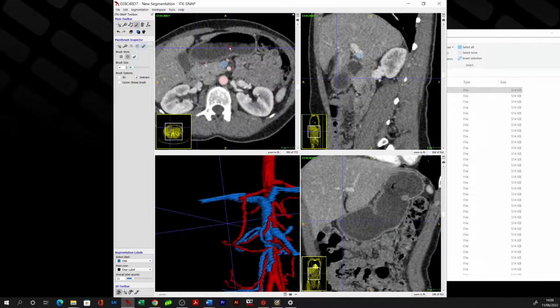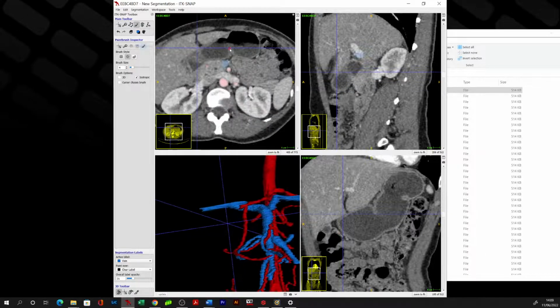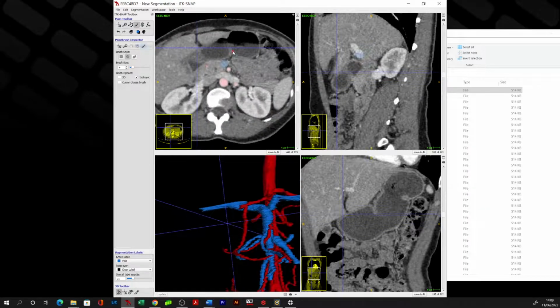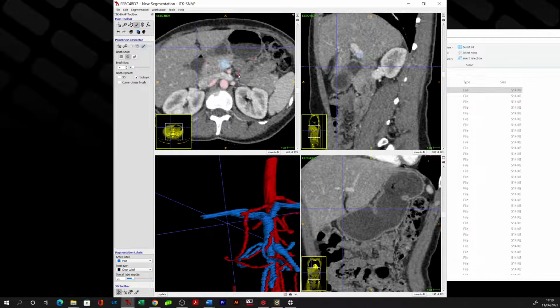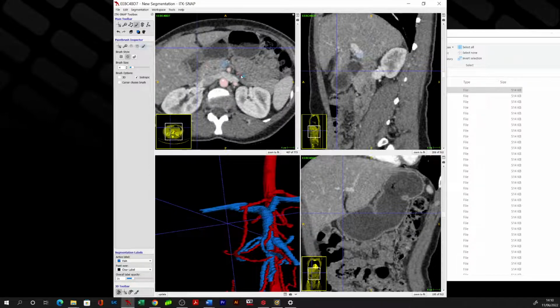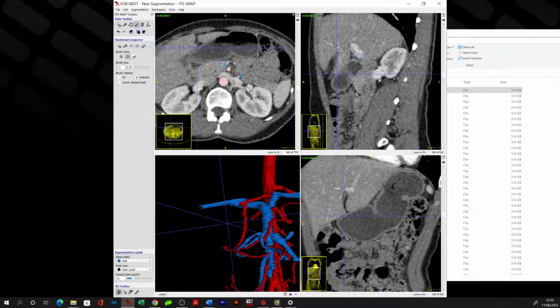Although it isn't necessarily absolutely relevant for the case, there may be an accompanying vein which drains along with it, and it does. So here we have another likely MCV branch, which is accompanying this vessel that is inserting laterally into the SMV, and again it's accompanying the arteries.